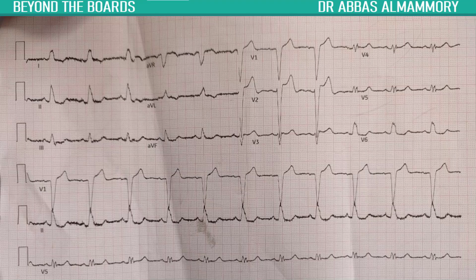The other thing that I would highly encourage you to do when you're looking at an ECG is to be systematic with your approach. The first thing that I like to do when looking at an ECG is to check the name, the date, the calibrations, and once I make sure those are in order, only then I can proceed to actually looking at the ECG. So I just take a quick scan at the whole ECG and see if there's anything that catches my eyes immediately. And obviously the striking features here are the wide QRS complexes and the ST segment elevations and depressions. Then we can go into the details of the ECG.